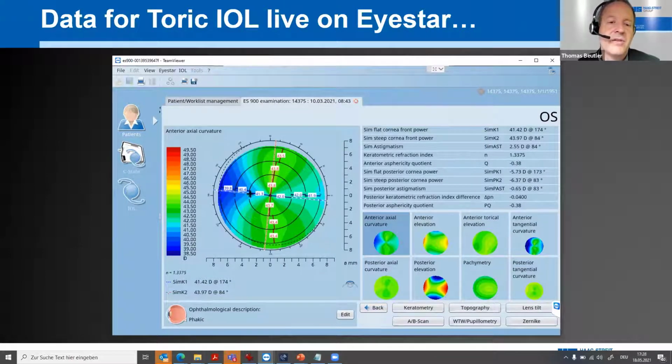You have the 3 millimeter zone, which can also be regarded as day vision, sorry, a 5 millimeter zone, which can refer to night vision, and then the 7 millimeter, which is the peripheral zone with additional value for the assessment of asymmetries of the cornea.